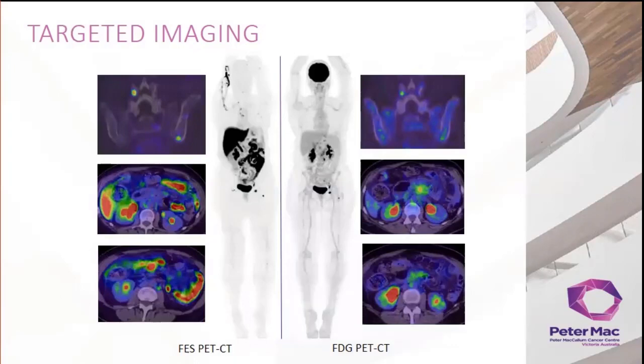Of note is that almost all of the bone lesions are occult on CT, and that many are only noted on FDG with knowledge of the FES findings. We also needed a biopsy target to histologically re-establish her receptor status, and FES showed a left inguinal node that was easily accessible to biopsy, saving her having to otherwise potentially have bone biopsies or invasive peritoneal biopsies. Also, an FDG avid groin node would have otherwise been relatively non-specific in the setting of metastatic breast cancer, but the fact that this was FES positive as well meant that we could be confident this was a meaningful biopsy target.